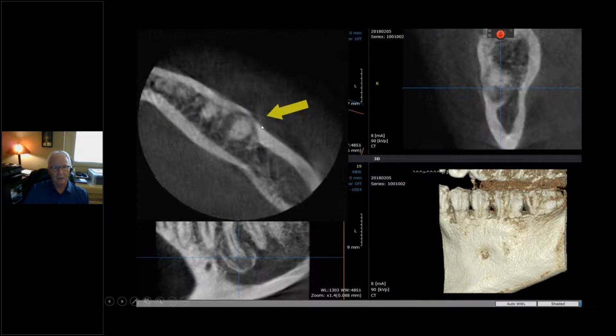And you can see I tried to show maybe it was starting to cause a small cortical perforation, and that might be what this represents here, although this is in a good location for the mental foramen too. So this is probably foramen, and this is probably the early remodeling or resorption that's occurring on the buccal aspect of this lesion. So focal osseous dysplasia, and you'll see it written in the literature as small FOD as opposed to florid, which is large FOD.